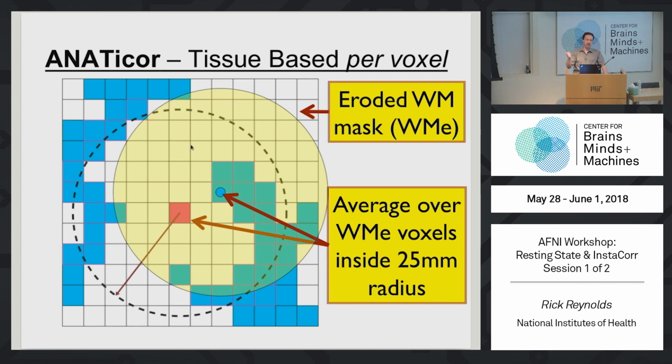And for the most part, as I mentioned earlier, that shouldn't correlate with too much, unless you have some artifacts in the data, which in fact we did. For example, little coil problems where the signal was changing a few percent asynchronously, a little randomly, over time. So this makes a difference for that.